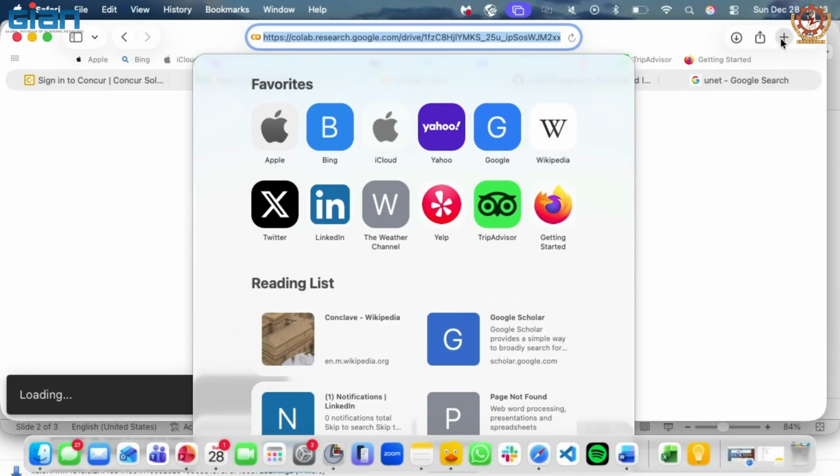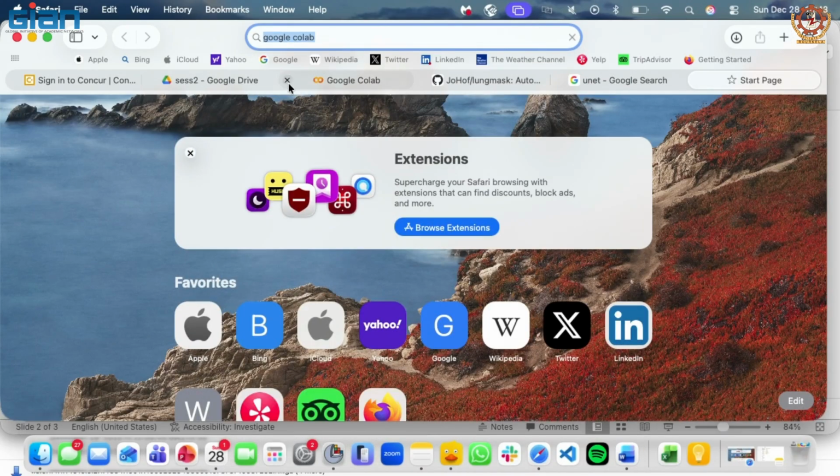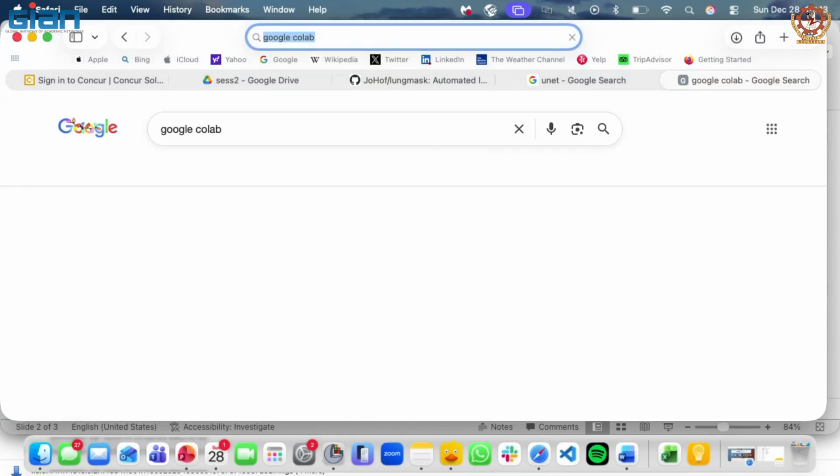But are you guys able to do it? Hmm. It's showing a warning: the following packages were previously imported into the runtime, however, you should restart. So we restart, and it's showing the same. So after restarting, don't run pip install TotalSegmentator.